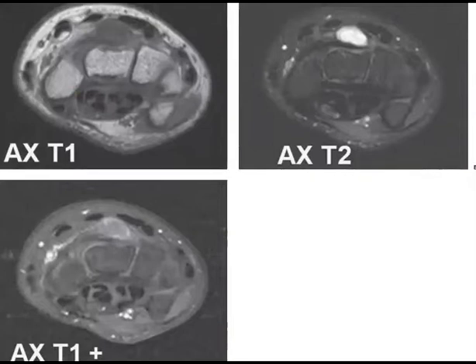What is your differential and how do you describe it? Nice. You will think that maybe it is a cystic lesion, with mild marginal enhancement, and it is in the dorsum of the wrist.